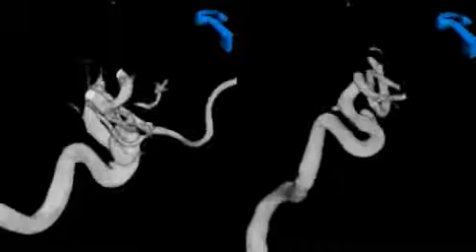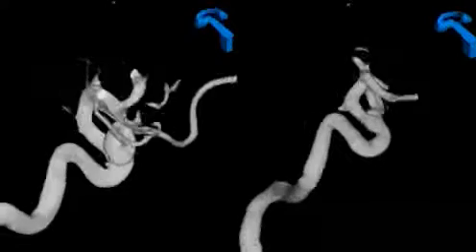If you think of the blood vessels as plumbing, they are normally smooth pipes that curl around and branch out into smaller and smaller branches until they nourish all of the brain. And then we see a bulge. In fact, we see two bulges, one quite large and the other one just below it. Both of those are actually aneurysms.